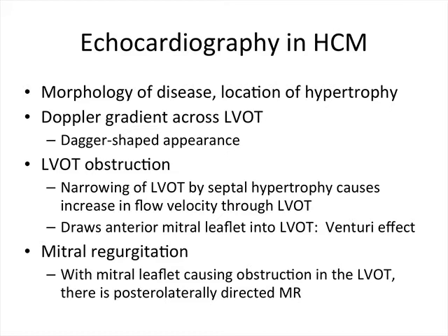The left ventricular outflow tract obstruction associated with hypertrophic cardiomyopathy is considered to be a dynamic process. There are more complexities to systolic anterior motion of the mitral valve than the Venturi effect alone, and we are not able to thoroughly review these during this podcast.